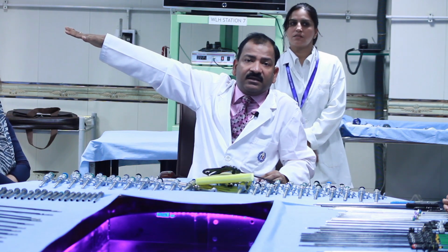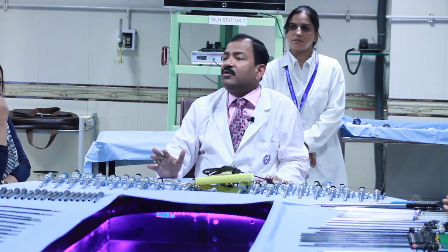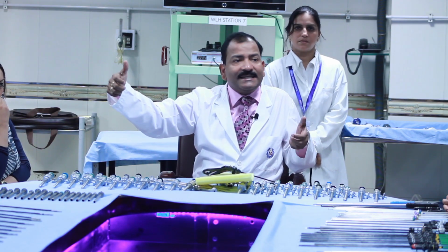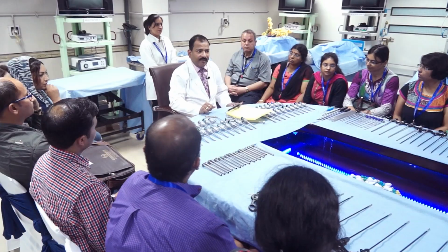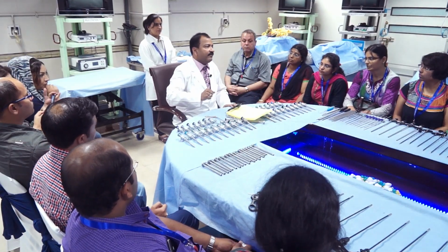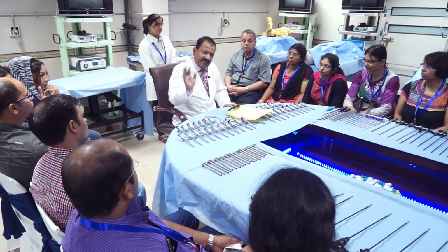After 5 minutes you will get a pain in the deltoid, and then you will no longer be able to perform. Even if you perform, your instrument will get a tremor, and your ergonomics will be wrong. So, maximum abduction of the arm required is 15 degrees maximum, 5 to 10 degrees is good, but less than 15 degrees.